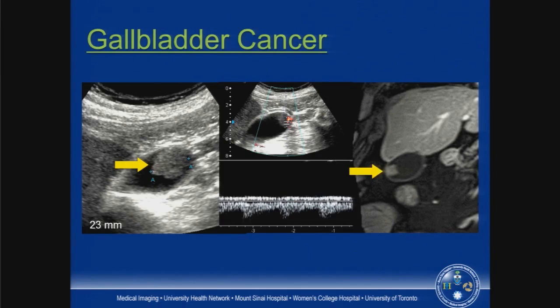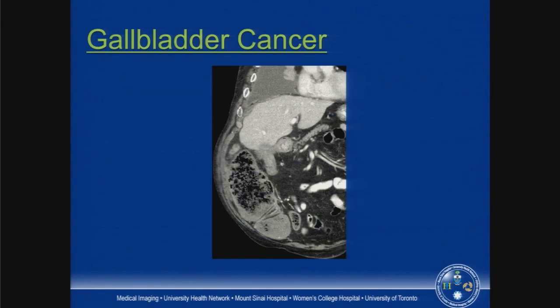I haven't been able to establish which, and came back last year with this obstruction of the right colon from an invasive cancer involving the hepatic flexure, and if you look carefully, lateral to that ascending colon, likely tumor seeding in the paracolic gutter. So you have to have some concern when you see larger polypoid gallbladder masses.